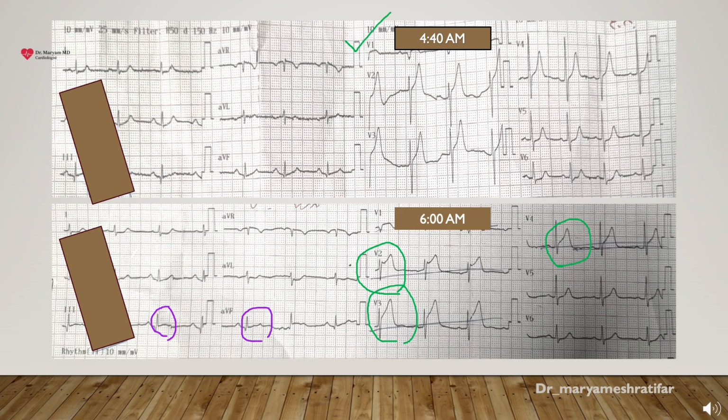The patient underwent angiography, and the culprit vessel, according to the ECG, was the LAD, which had a subtotal cut from the proximal segment. Although there was also significant stenosis in the LCX and RCA, the patient is ultimately considered a three-vessel disease case.